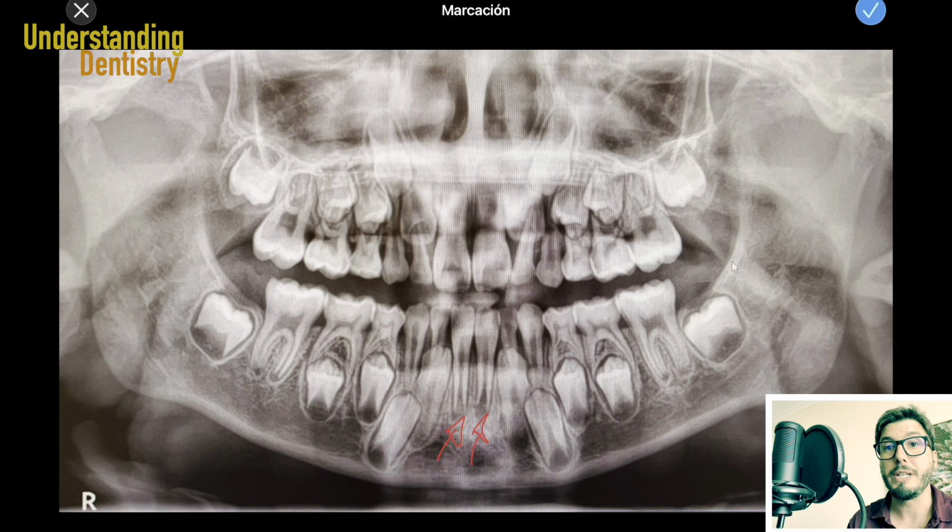Now you can count all the teeth because you already know the normal positions. And then if there is a mesiodens or a supernumerary tooth, you'll be able to realize immediately because you know the correct positions. Here, for example, we are not seeing the root of the deciduous lateral incisor resorb. And this would be a little bit more common. At 10 years old, for example, this root would usually be a little bit more resorbed, all right? But okay, we can see the permanent lateral incisor in position, coming, and then we can follow up this situation, all right?